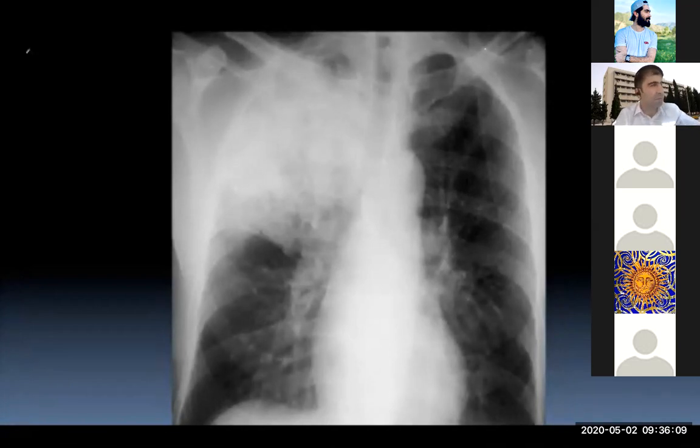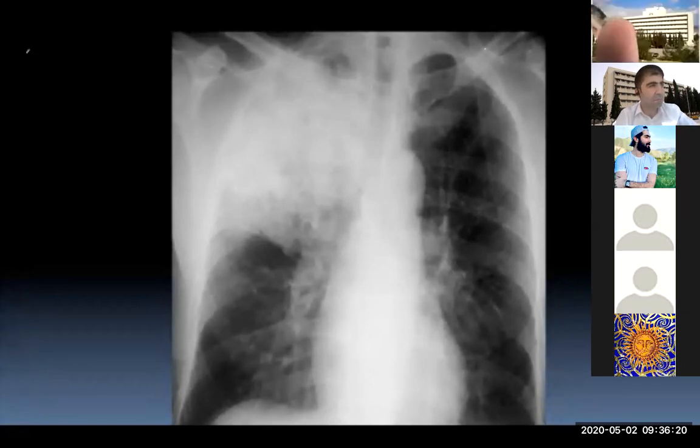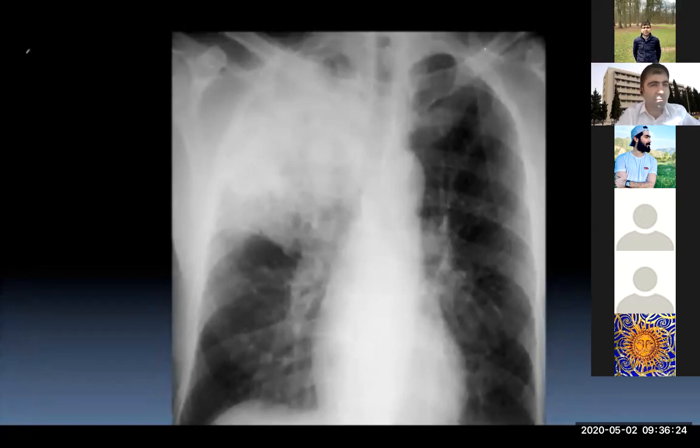About the diaphragm, I cannot see the left hemidiaphragm, but the right one is clear. It's in normal position.